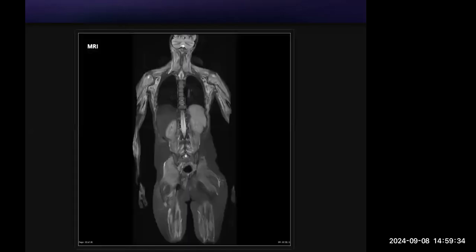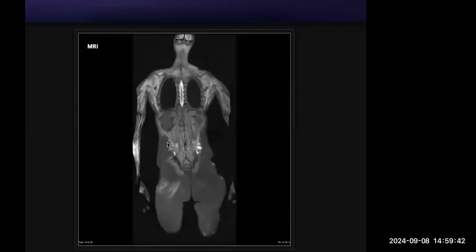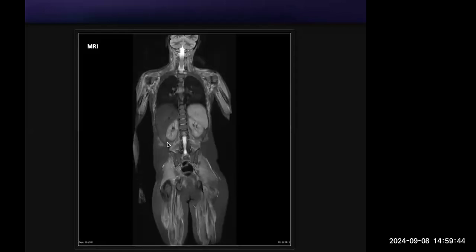Yep. This one, you were spot on. It was myositis, but I would have been happier if you had specified it as dermatomyositis. Under myositis, we have two entities, right? Dermatomyositis and polymyositis. In dermatomyositis, as the name goes, the skin involvement will be there, but when it's only the muscles that are involved, it is polymyositis. More of subcutaneous involvement is for dermatomyositis.